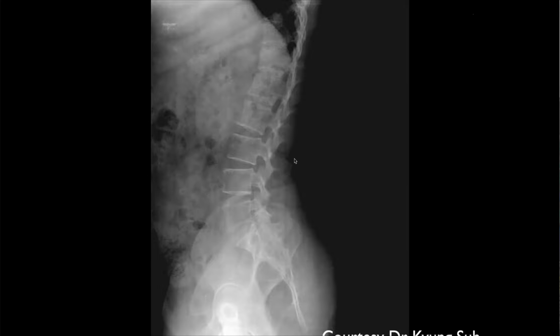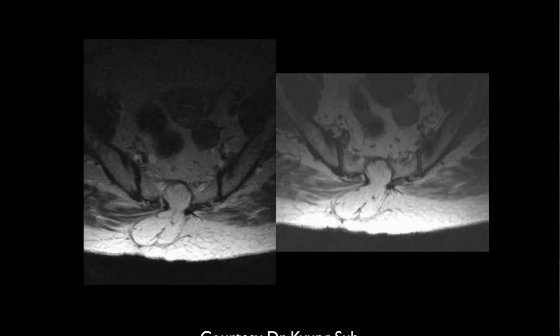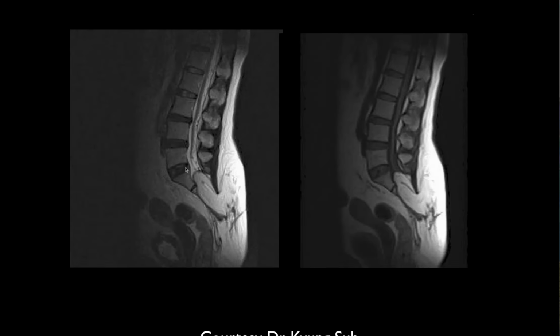Laterals. Yes. Okay. There's the MR. So there's like agenesis of the sacrum. And what do you think this is? I thought it's not a foregut duplication cyst. It could just be some type of granulation tissue. These are T1. That's a T2 weighted image. This is a T1 weighted image. So what kind of tissue is this?